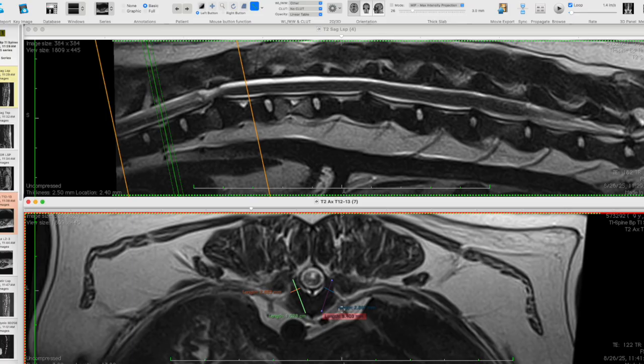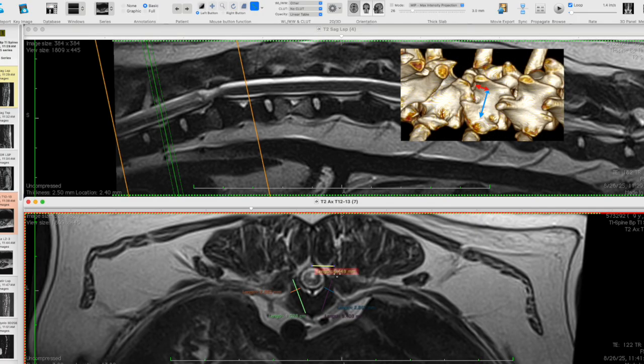So from this, I'd probably end up using 2.2 millimeter diameter screws, and my length is probably going to be around 1 centimeter. Now the other measurements I find beneficial are the point of insertion from midline. So if I pick midline and draw a straight line out perpendicular to the longitudinal axis of the spine, I come to approximately where that insertion would be.